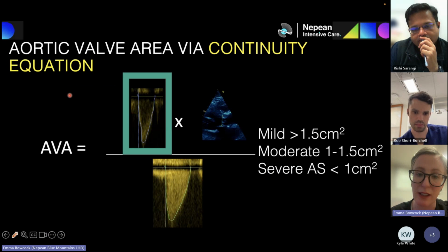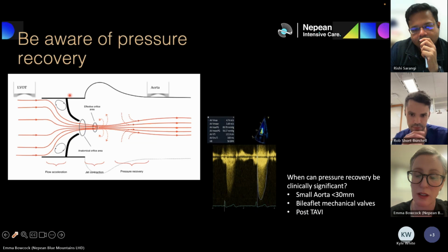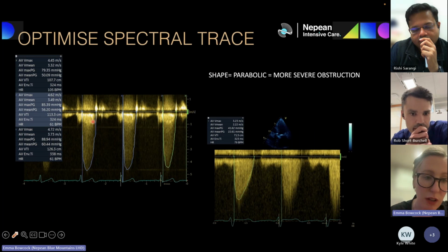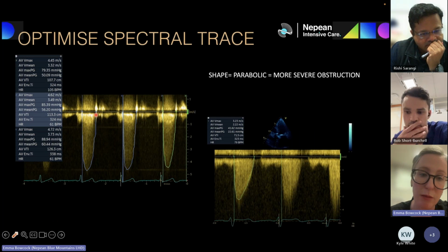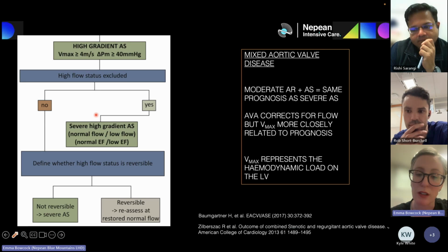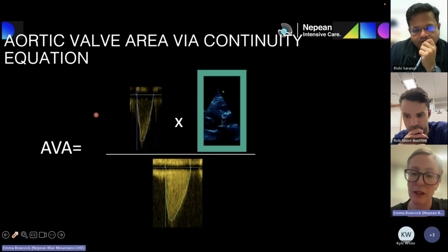You can imagine why, right? So if I'm tracing that out, let me just show you this one. This is what they'd be tracing out. I mean, how inaccurate is that going to be, really? It'll give you a bit of an idea, but no, you shouldn't be doing that as your gold standard. Definitely not, and it is advised against.